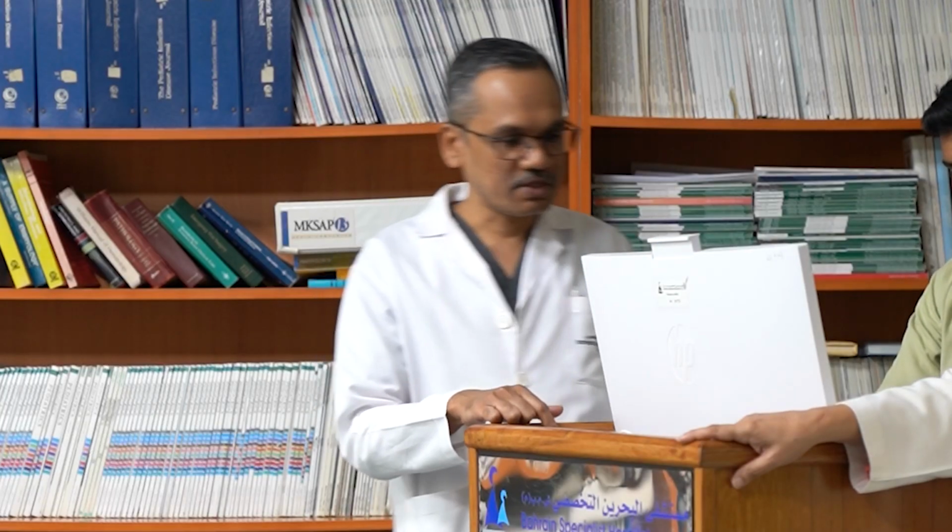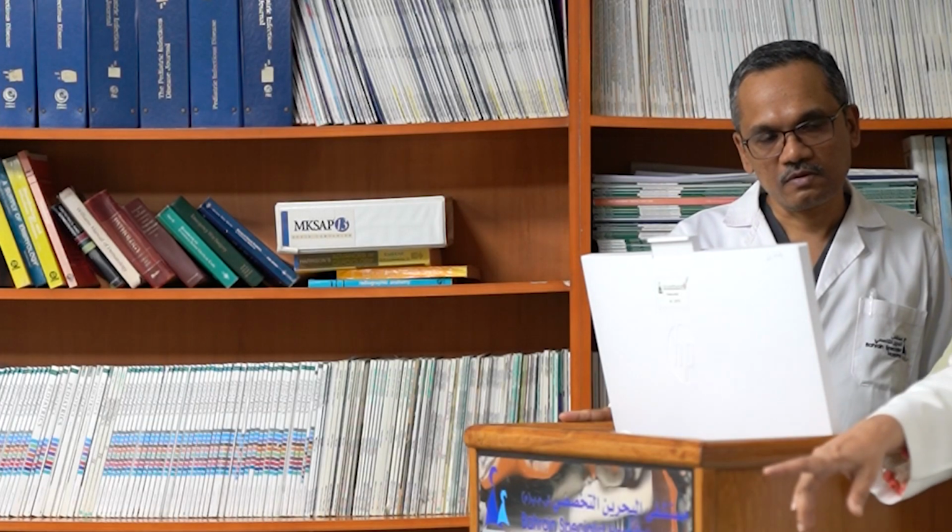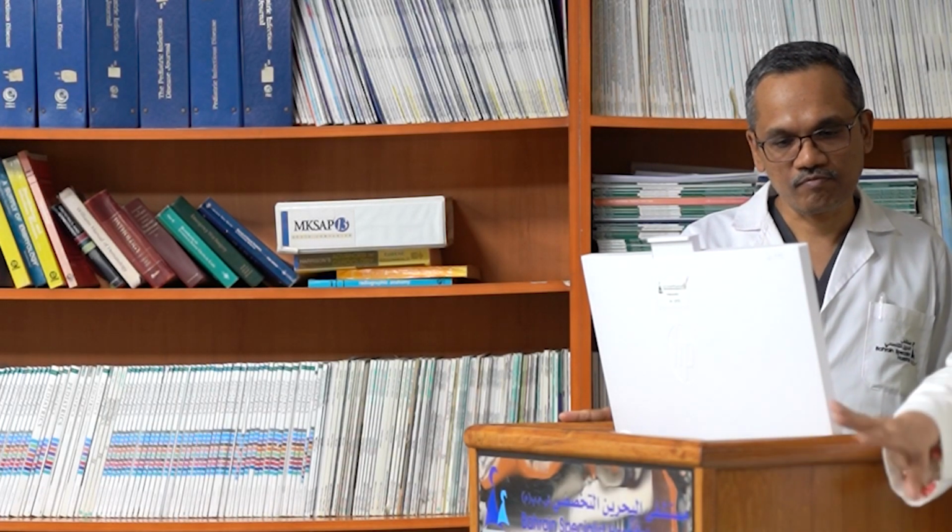I'll just show the imaging features which are more worrisome actually. Actually, for LI-RADS, I would like to say that LI-RADS is only applicable in cirrhotic patients. It is not for any other lesion. Cirrhosis or chronic hepatitis B. You fit this guy on LI-RADS 4? 5, ma'am. 5. Because it is showing all the ancillary features, diffusion restriction, washout, which is a major criteria. Only in that spot within, yes, one nodule.